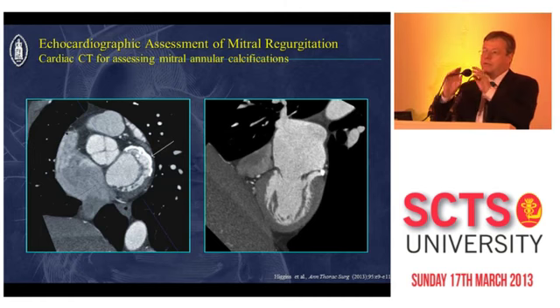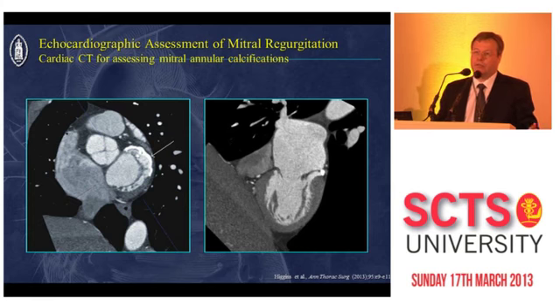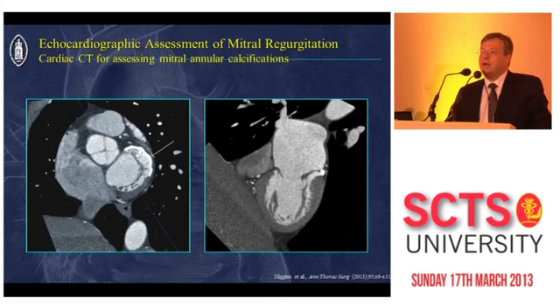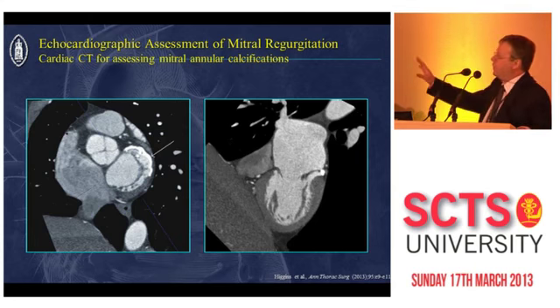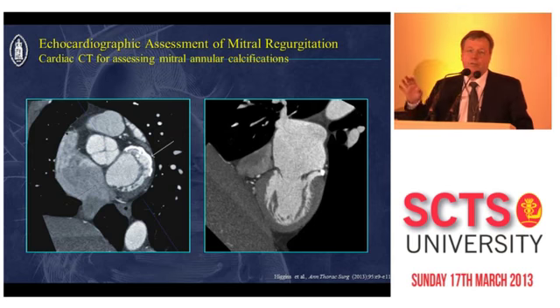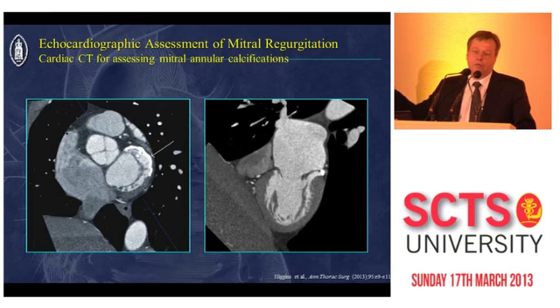So I've tried to illustrate the fact that we can assess the pathology. This has an implication for the repairability of the valve. 3D is certainly helpful in defining all the different aspects of pathology. It is much easier to use than 2D, although sometimes you have to go back to 2D reconstructions. And finally, I've just touched upon factors that affect the risk of SAM and the role of calcifications and how you should tackle them with echocardiography or with CT.